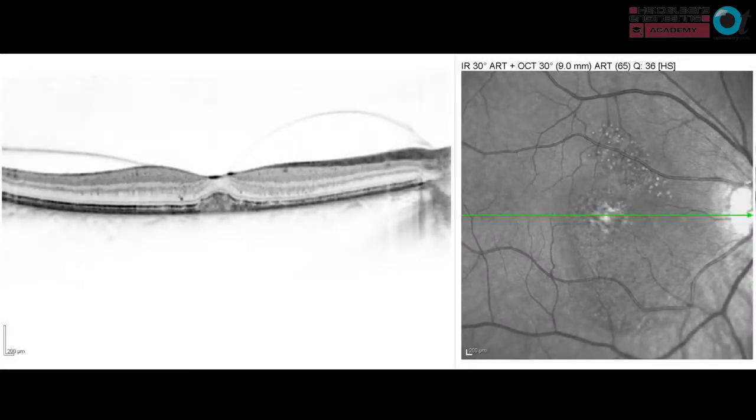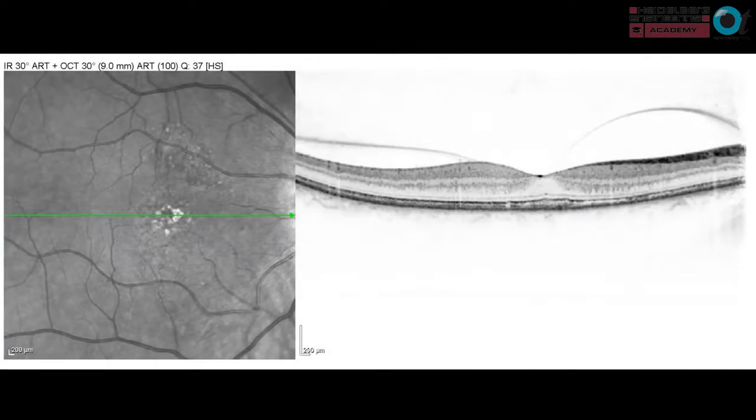And we treated this lady with laser, and if you look at that infrared reflectance on the right hand side, you can see the tiny laser spots that I applied, with excellent resolution of that macular edema. Six months post, almost normalization with good recovery of vision.